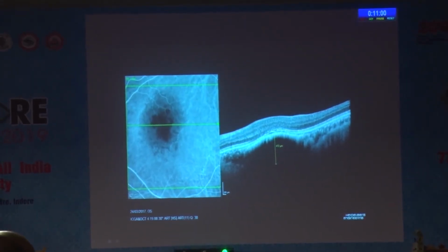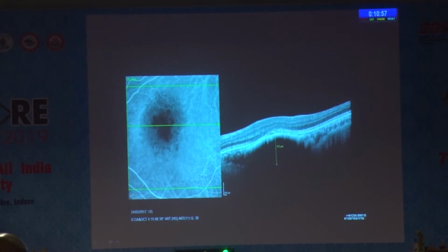It looks like a nevus. There's a push from below, and it's pretty large. The whole thing, this entire shadowing out there. The RPE is pushed up. How much is it? 400 something. Yeah. Would you like to comment first about this, and how it corresponds to the previous slides we saw? Yeah, so that RPE disturbance is what I was saying. Something is pushing the RPE, and that is leading to that reddish discoloration. That's what I would say. So my differential still, I think, is probably a nevus.